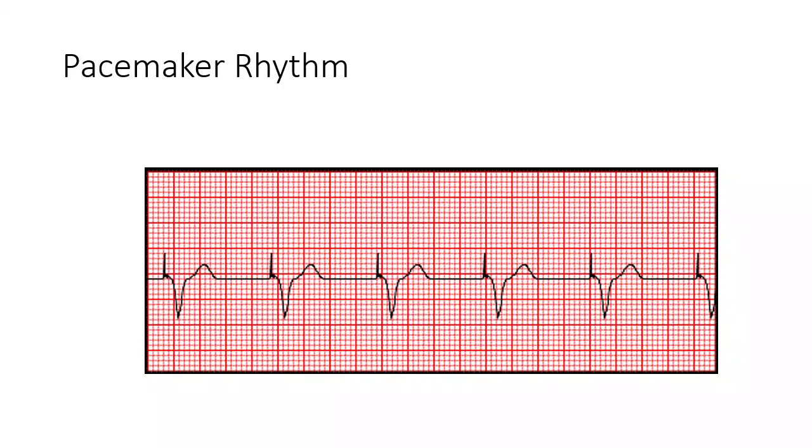So you got to look at the whole rhythm. Now, if we didn't have these pacemaker spikes, and if we didn't have a T wave, idioventricular will only have a wide, bizarre looking QRS. So you won't see the pacemaker spike in front, and in idioventricular, often, not always, you won't see this well defined T wave. But if there was no pacemaker spike in front and you called it idioventricular, I'd give that to you. But again, this is a pacemaker rhythm.